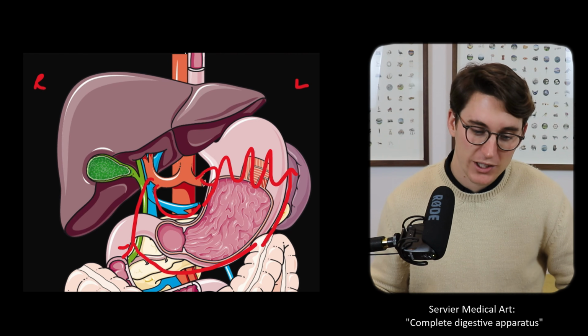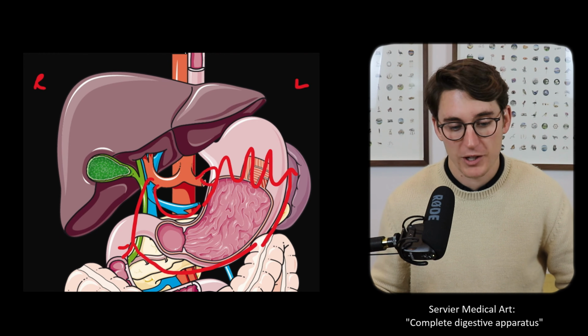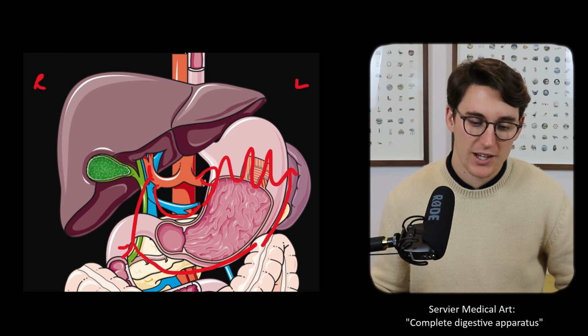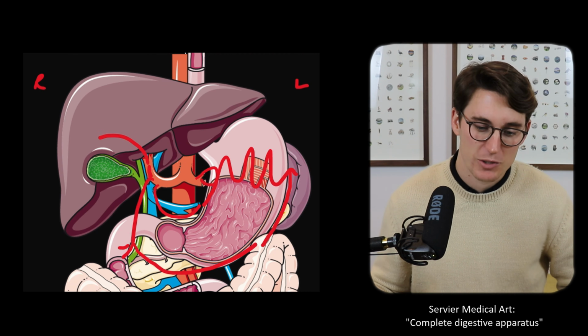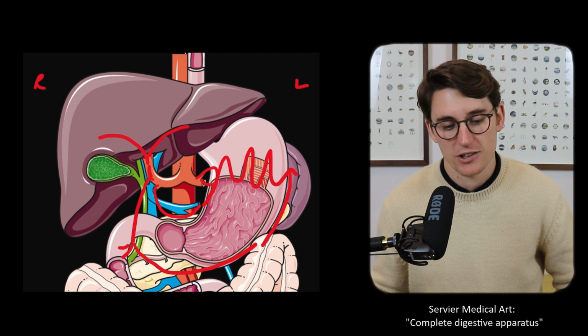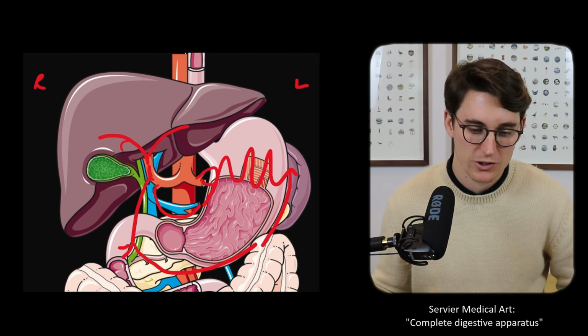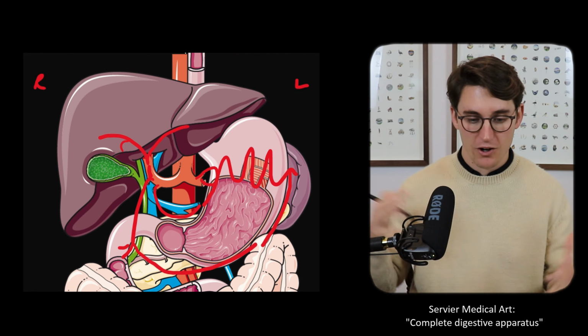Once our gastroduodenal artery has branched off of our common hepatic artery, the artery then is known as the proper hepatic artery. And this has a right hepatic artery branching off and a left hepatic artery, with this right hepatic artery giving off a small little cystic artery that's going to go to the gallbladder. So now we've got our orientation.